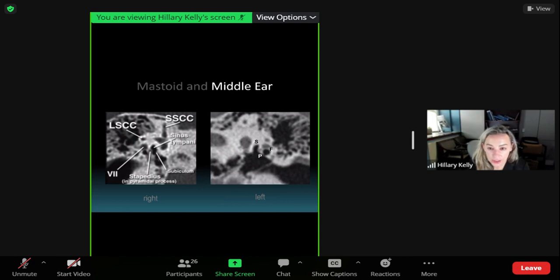Lastly, just to finish up the middle ear cavity, the hypotympanum is kind of variable in size. It's inferior medial to that piece of bone where you have the inferior attachment of the tympanic membrane and the base of the cochlear eminence here. And so it's usually just air filled. There's usually nothing in it, and it's usually smaller than the rest of the middle ear cavity, but that's the hypotympanum. All right, so posterior to the middle ear is the mastoid, right?